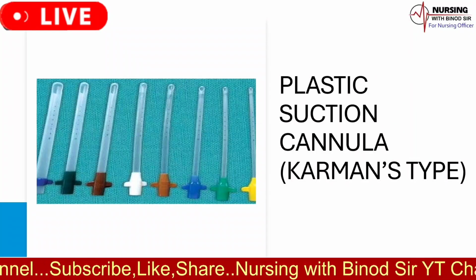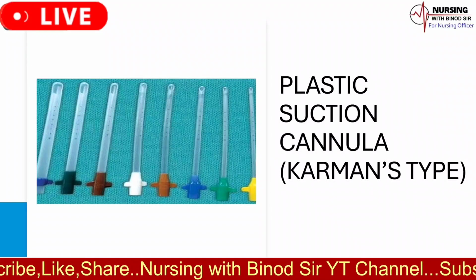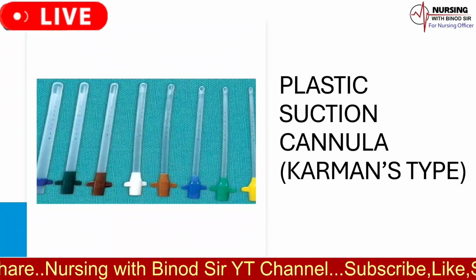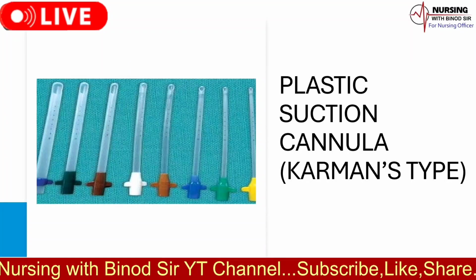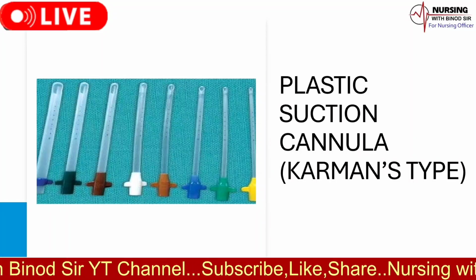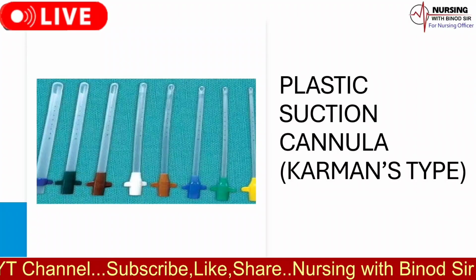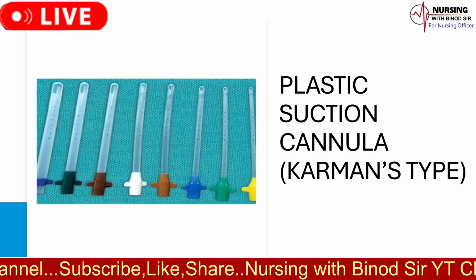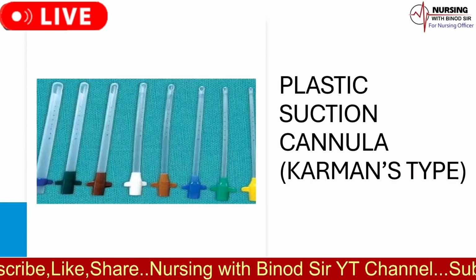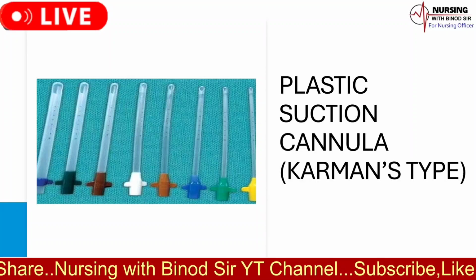3. Dilation and curettage, D&C helps in scraping and suctioning tissues during D&C procedures. 4. Less tissue damage, designed to cause less damage to the uterine wall compared to metal cannulas. 5. Biopsy procedures, used in conjunction with MVA syringes to assist in endometrial biopsies too. 6. Sterile and single-use, ensures minimal risk of infection as these cannulas are sterile and made for single use.